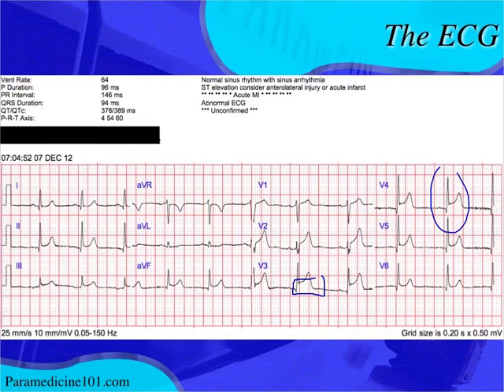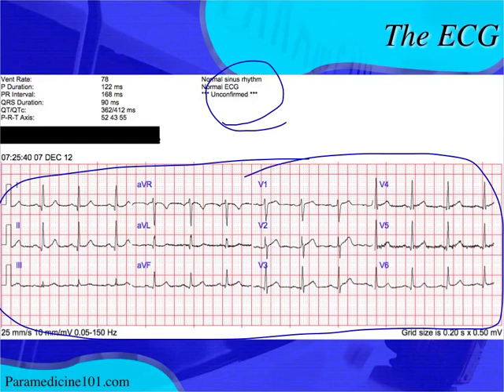You have very tall R waves in V4. You have a very short QT interval. I mean, all of that does lean towards early repolarization, but this is in fact a STEMI, okay? And we found out by doing consecutive 12 leads. And I mean, look at the times here. That's why I left the time on here.